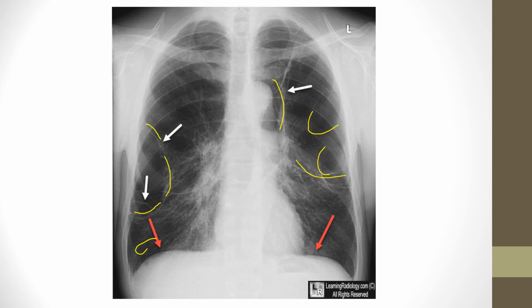And you can go back through and look at these on your own. Of course, you guys have access to the PowerPoint as well. And you see all these areas, those are just signs of areas that have been radiolucent, just destroyed tissue from emphysema. And you can classically tell this patient's hyperinflated as well.